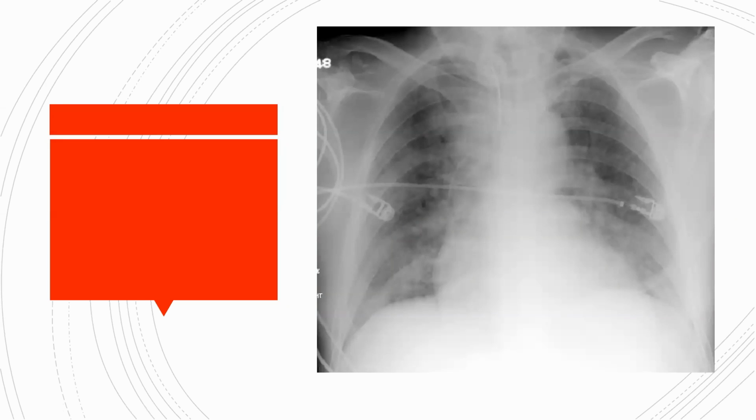Ooh, this one is quite bad. It's quite tricky. This is a bonus one. So if you guys don't get it, that's fine. It looks like it's like this cotton wool everywhere, doesn't it? So I think if I remember well, this is a condition we haven't covered, so it will be a bonus question.